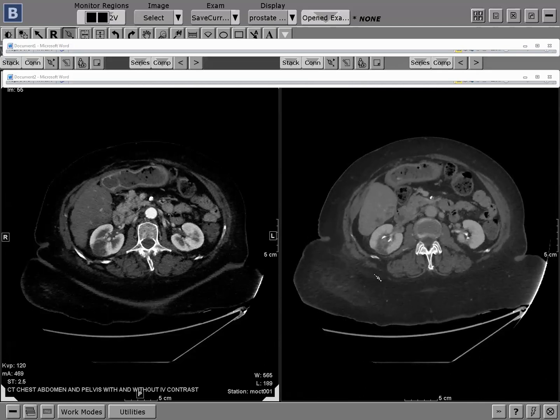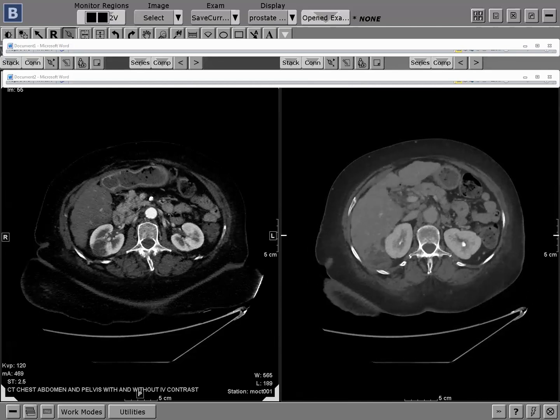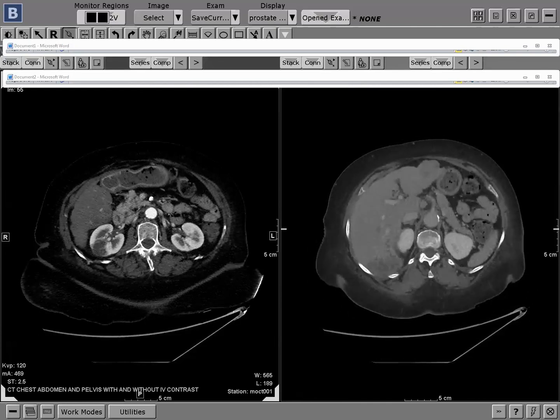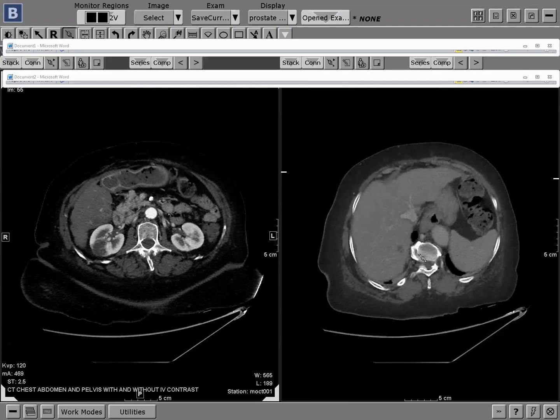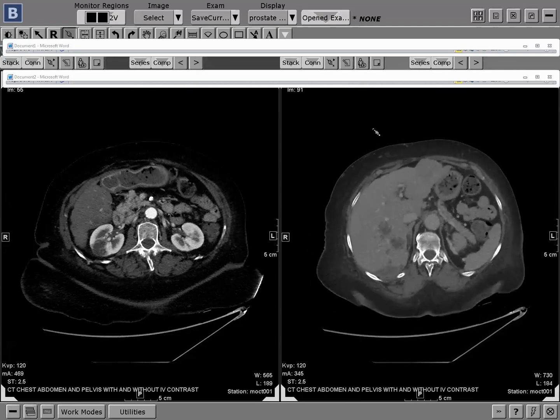And you can see the same thing, right? The capsule enhancement is preserved over the renal infarct. The same thing, the capsule enhancement is preserved over the liver infarct. I don't know. It's a pretty cool case. Very cool. This is a hard case. Very hard case.